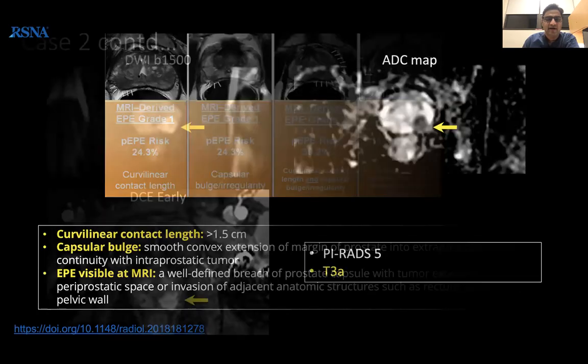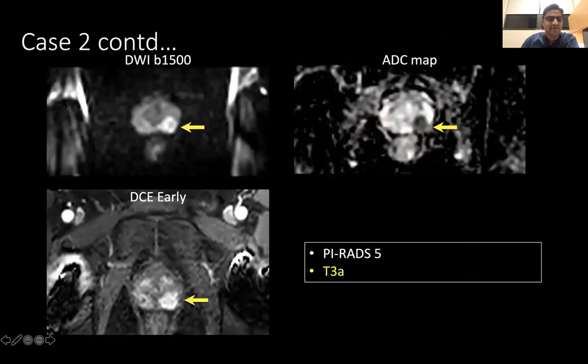As we go back to this image, we can see that the phase is A to P in this setting. This is a reduced field of view DWI. And we can see that the artifact from the hip prostheses is pretty much in this direction. And this is a selective excitation going on in this particular field of view. And there is hardly any distortion of the prostate in this particular patient.